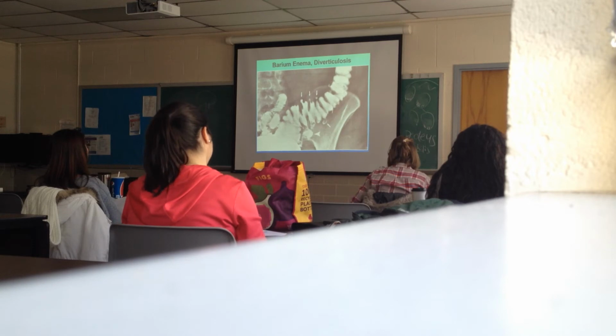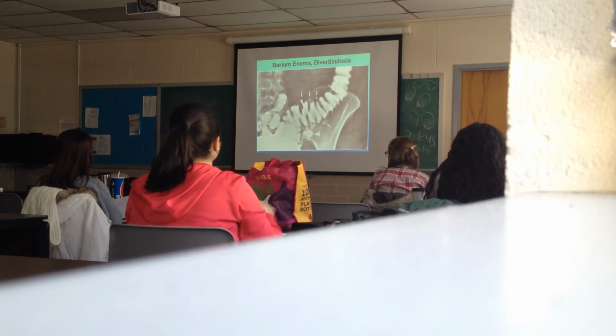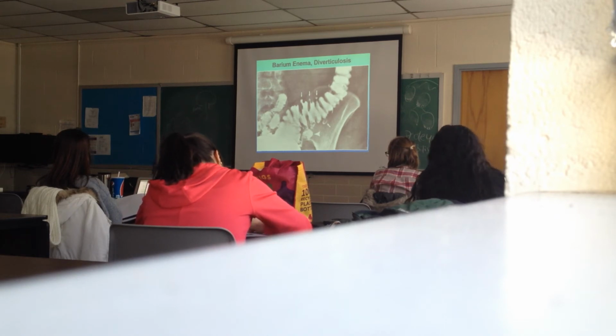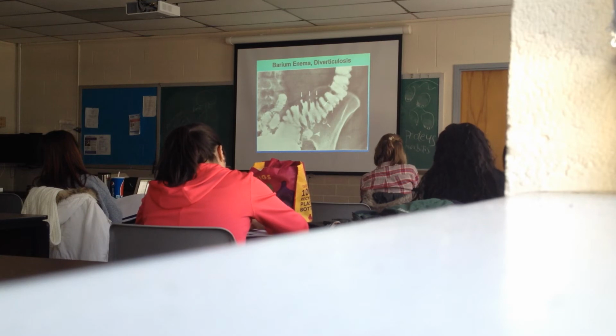Diverticulum. Again, another lower GI study. What do you think that is right there? That's the rectal vault. Okay. And what's this over here? Small or large bowel? Small bowel. And of course you've got the sigmoid colon.